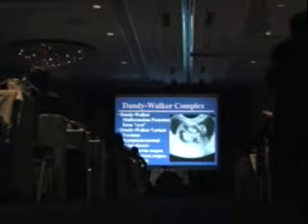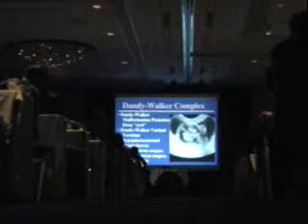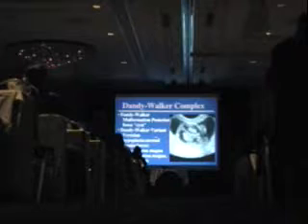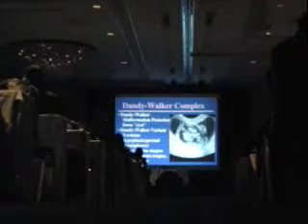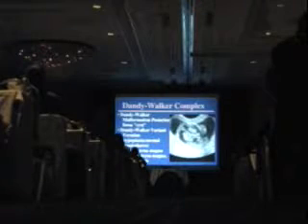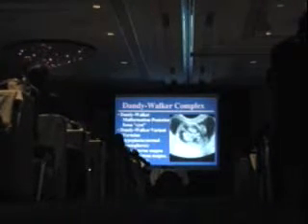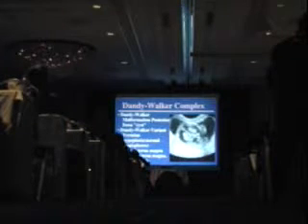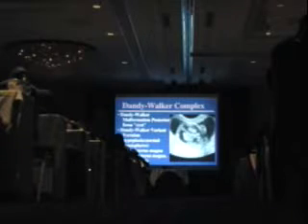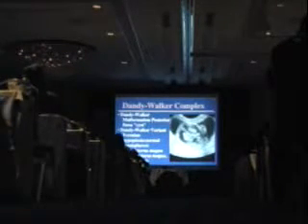And then the cerebellar hemispheres are these little teeny-weeny things that are just pushed over to the side, and you can see it here as well. Dandy-Walker variant, the vermian hypoplasia, is less severe. It's mostly inferior vermian agenesis, and the cerebellar hemispheres are actually almost normal size. They can be a little bit small, but they're not half as small as they are in the full-blown syndrome.